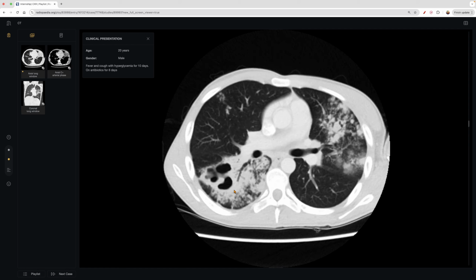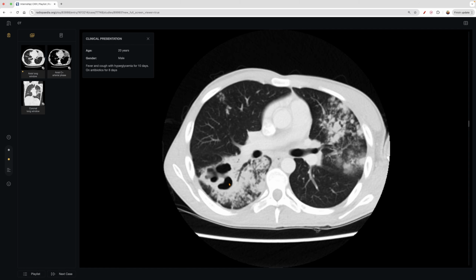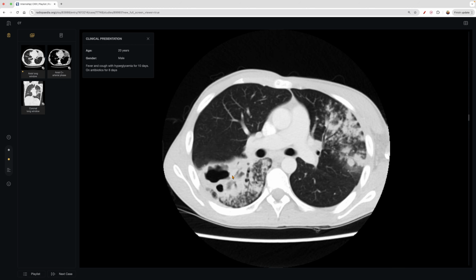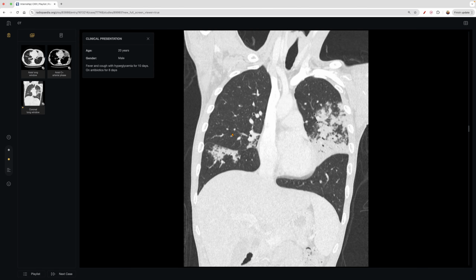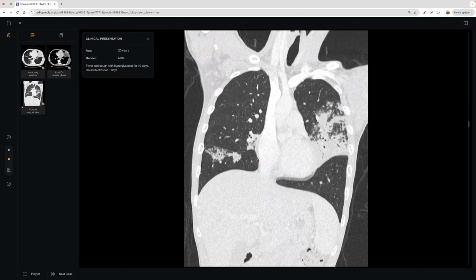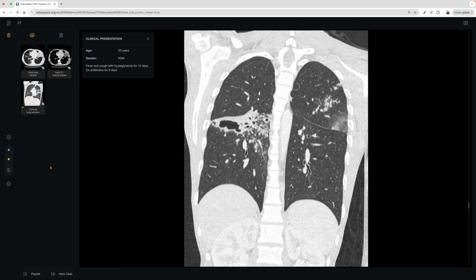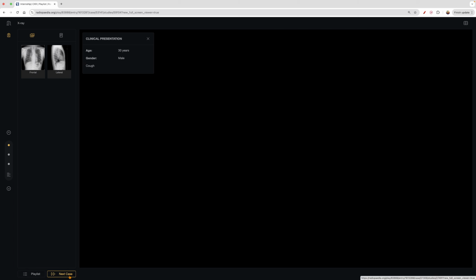And we go more superiorly, and then here we go. There's this cavitation, right? Hypodense inside, very lucent, and then you see all this consolidation around it, thick-walled material. This patient went on to have tuberculosis, I believe. Yeah, this was tuberculosis. And then a coronal, you see the same ideas. And then you can go here, all that consolidative material, and then we go back posteriorly, and there's your cavity again. That's seeing it in a different view. So a chest radiograph gives you the clue in. That's a quick, easy, cheap test to see if we need to do anything else.